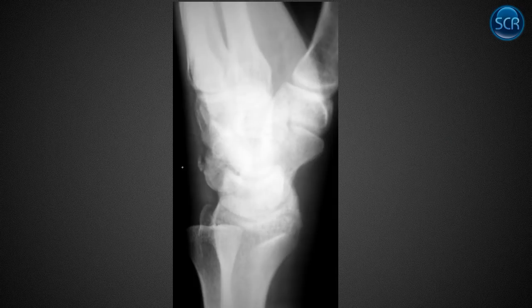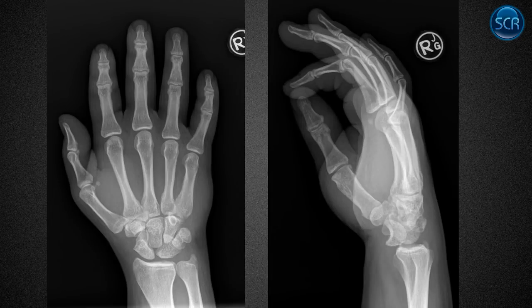Here's a triquetral fracture. And as triquetral fractures manifest, it's a little flake of cortical bone that's been avulsed off on the dorsum of the wrist. So this one's kind of an oblique lateral. But we can't really say definitively where this is coming from. Scaphoid's here, lunate's here, so this has to be the triquetrum. But if you see a little fleck of bone along the dorsum of the wrist in the context of trauma, that's a triquetral fracture. So you should not miss that.